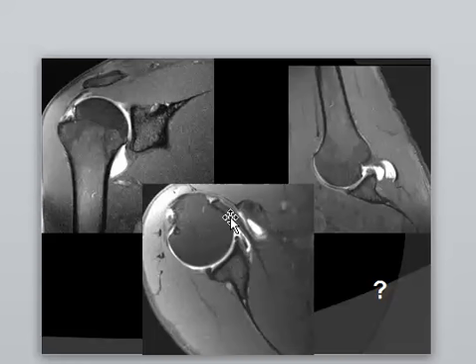So partial tear of the infraspinatus, and superior labral tear, SLAP.